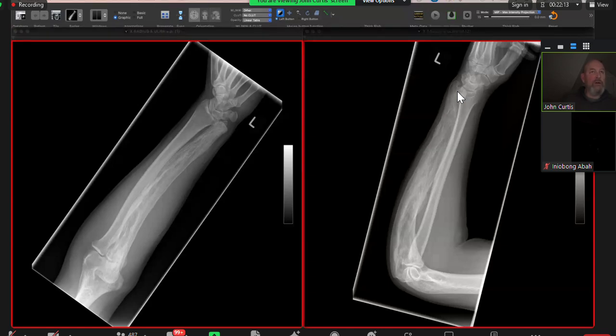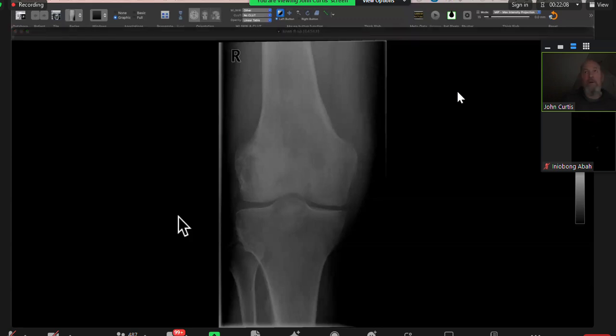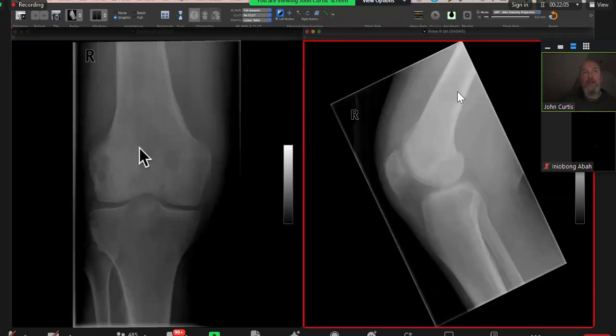This one I showed you was osteosarcoma of the femur. You can see this sclerotic edge. There's a bit of cortical destruction just here. Look at the sclerosis of the femur compared to the tibia. And that is actually normal bone, although it looks lucent, because everywhere else is sclerotic. And we've got this periosteal reaction. And that turned out to be an osteosarcoma.